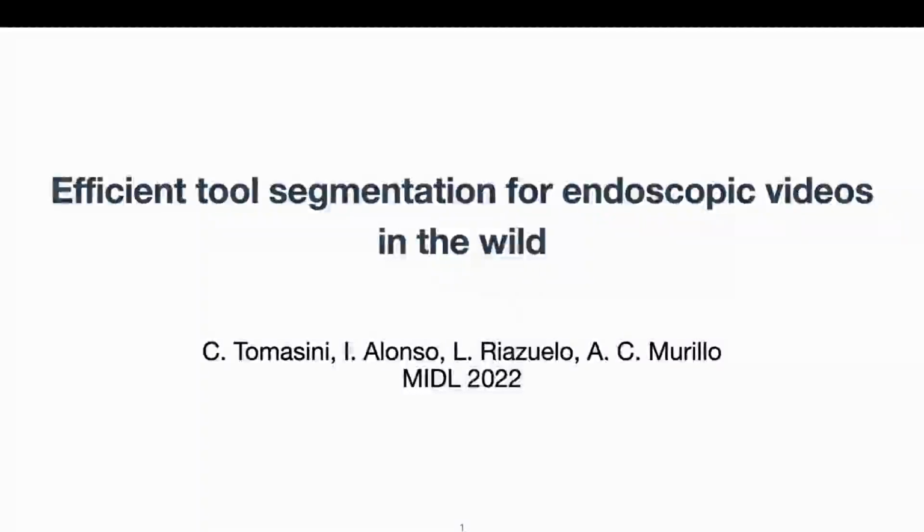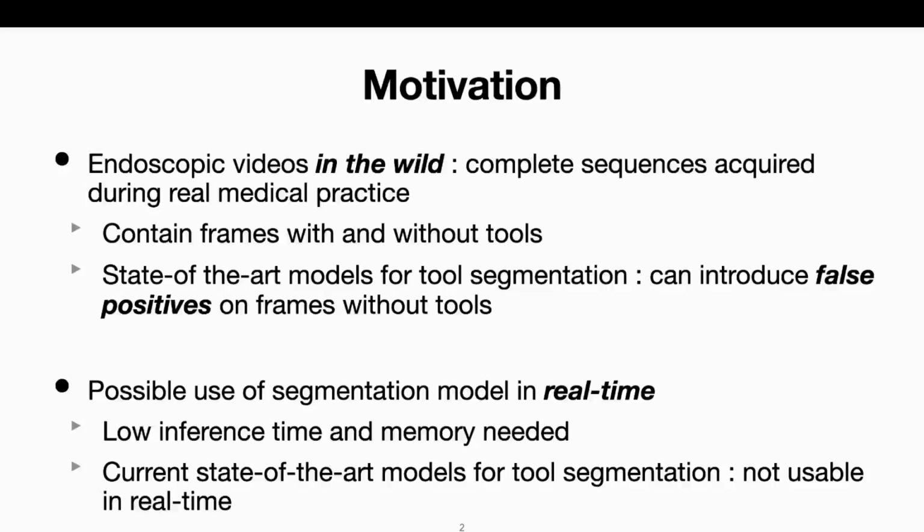This work focuses on developing an efficient pipeline for tool segmentation in endoscopic videos in the wild. The problem of tool segmentation in endoscopic images presents several challenges. We focus on two significant ones in this work.